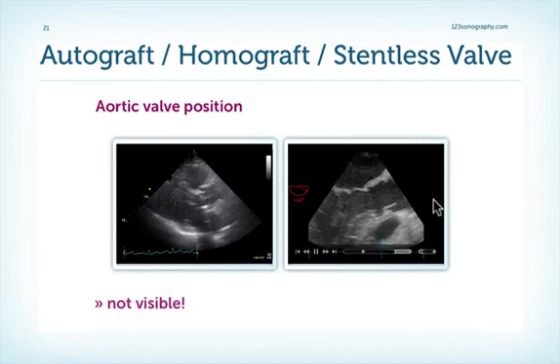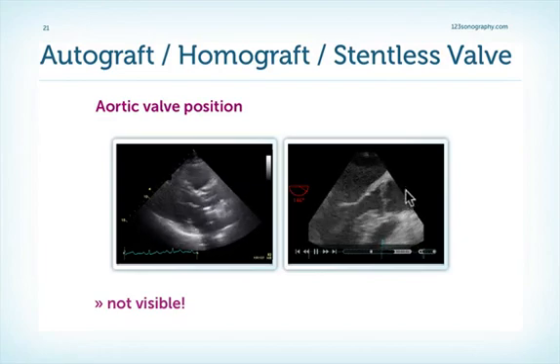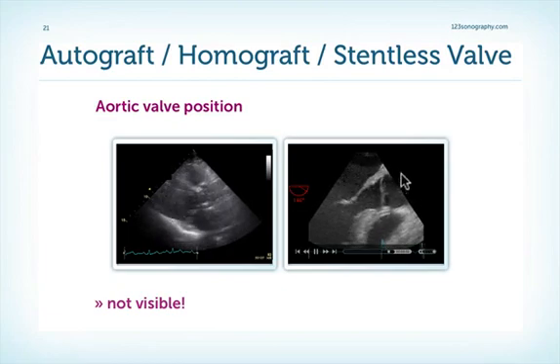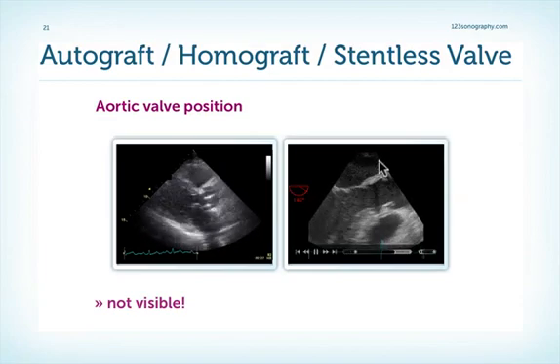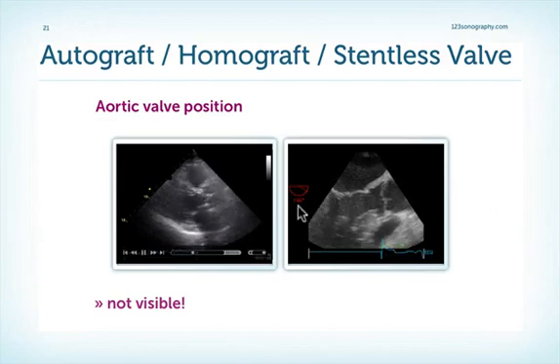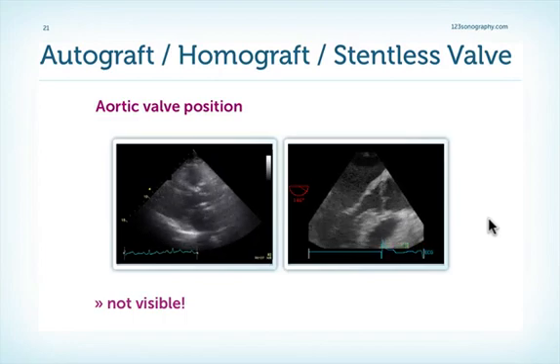And here's an example of a patient who had a homograft implantation following endocarditis of the aortic valve. The only thing we see here is that the valve is a bit thickened maybe, and that we have a thickened intervalvular fibrosa and aortic root, which is due to the surgical technique which was used. This patient also had perforation into the left atrium from the LVOT, and this was covered with a pericardial patch. So in general, very difficult to really detect and to make the diagnosis of a homograft if you do not have the information.